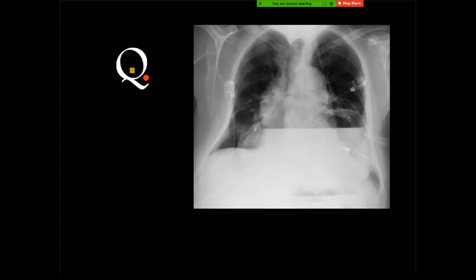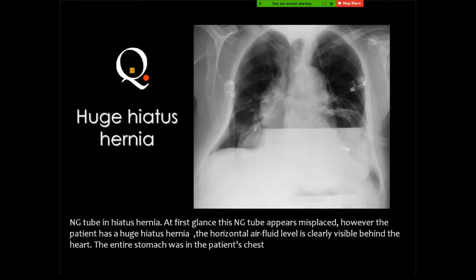Pneumothorax. Which side? The left lower. The left is clear. The left costophrenic angle is clear. Hydropericardium. Hydro? Pneumopericardium. Hydropneumopericardium, but this is the right cardiac border which is free. Hiatal hernia. Hiatus hernia. This is a massive hiatus hernia, and it contains an air fluid level, of course, because the stomach is totally herniated in the hernia, and the gastric contents will form this fluid level.